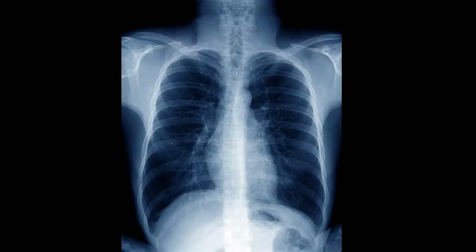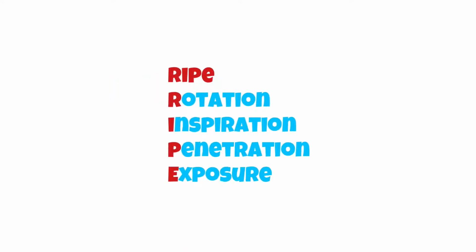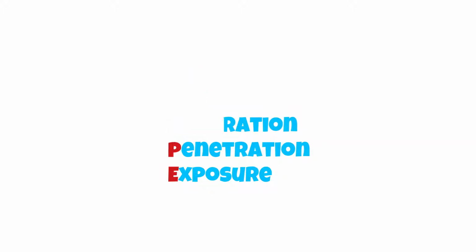The next step is to be able to comment on the quality of the film. We often use the abbreviation RIPE, R-I-P-E. This stands for rotation, inspiration, penetration, and exposure. Let's have a look at each one in turn.